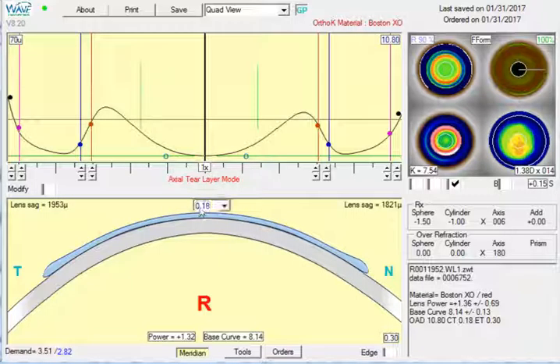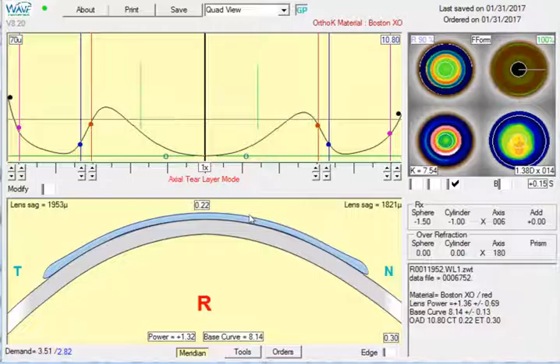Last thing I noticed is it's pretty thin on this side. This is probably just WAVE automatically changing your center thickness when you might have changed one of your dimensions. But 18 is probably thin. I would bump up to at least 22 for center thickness so we don't get any flexure or warp on the lens. So those are my thoughts.